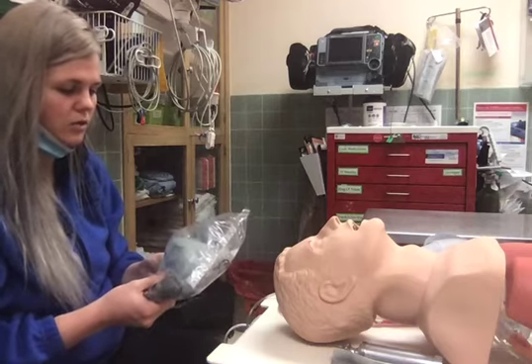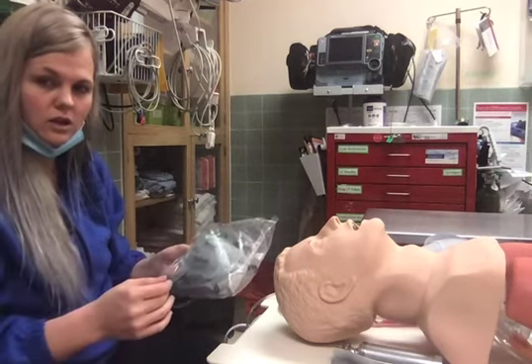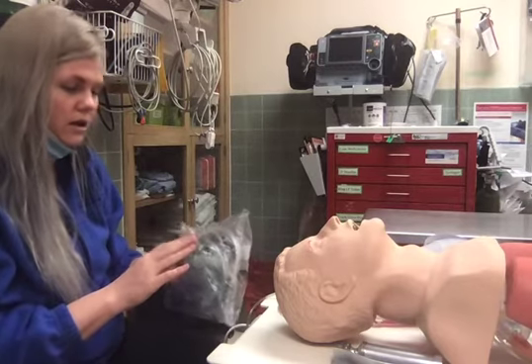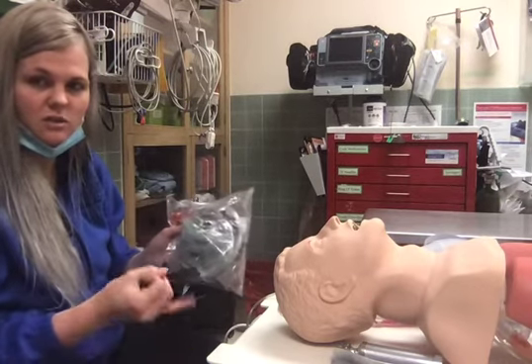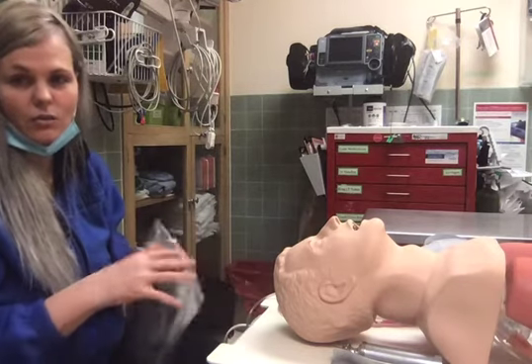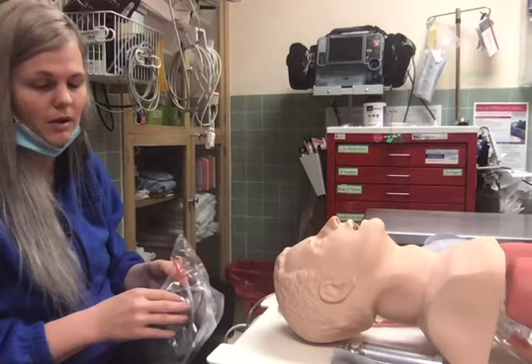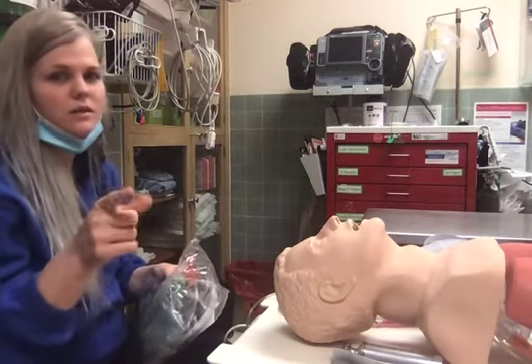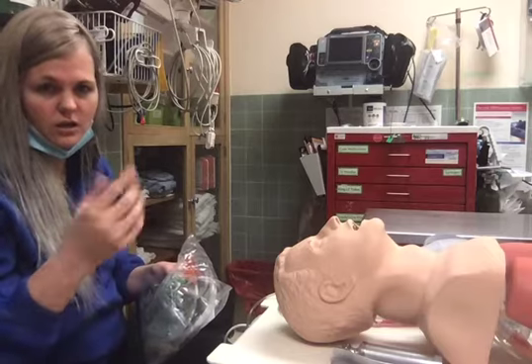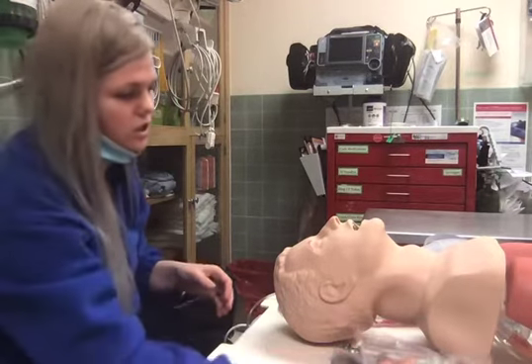You get a little bit more risky as you move up the scale of your oxygenation ladder. One thing that has to be present with this is they have to be spontaneously breathing. Another thing is if they're nauseous, I will not put this mask on them. If you take a look at the picture in the presentation, you can see that it's really attached to the face.